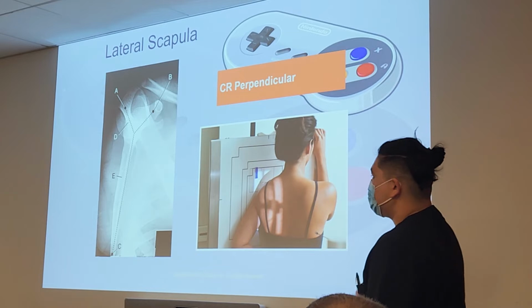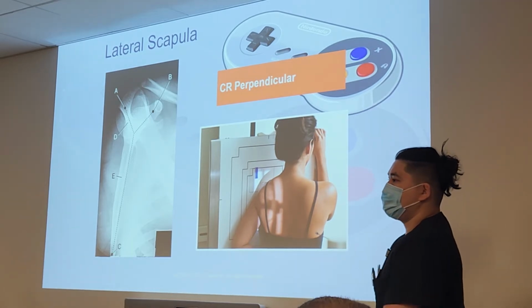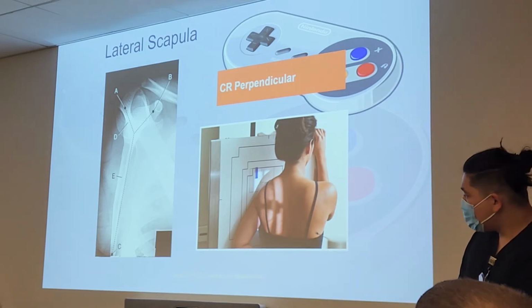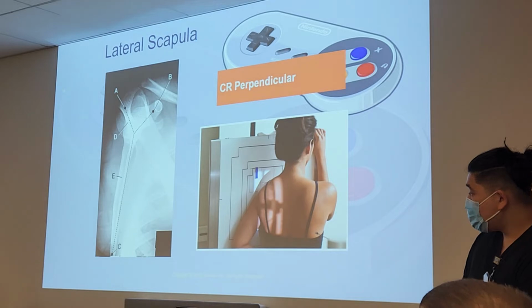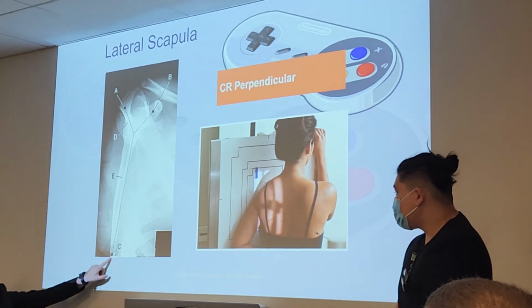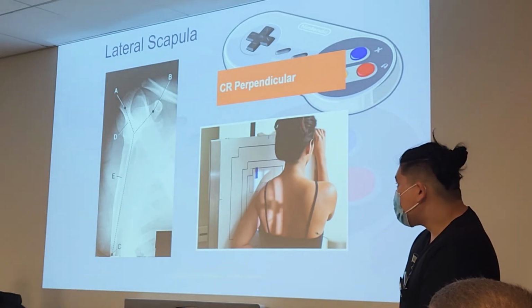I have a question for y'all. Is that X-ray optimal? No. Why not? No marker. What else? I will say she clipped the inferior angle, quite a bit of it. So you need to repeat that to include that, for sure.